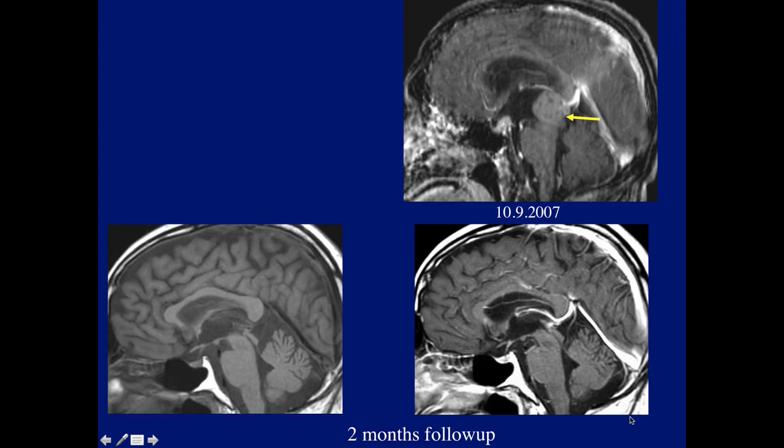These two studies are 2 months follow-up. What's the diagnosis now? The patient was treated, and that's how it looks 2 months later. None of the diagnoses so far mentioned. What lesion melts away quickly after treatment? Correct. Richard mentioned the correct diagnosis. This was a germinoma. So within 2 months, it was gone from the pineal region.